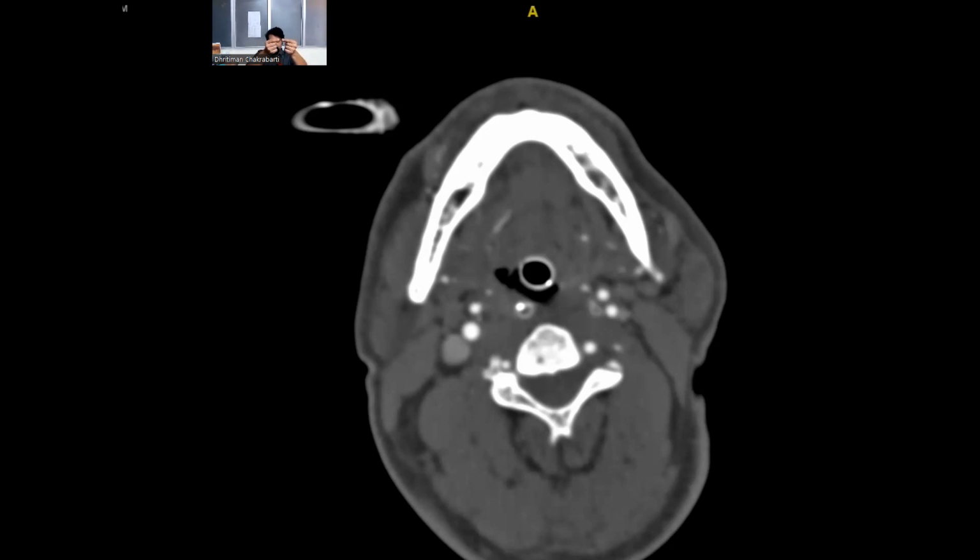They go ahead and join in the middle to form the anterior communicating artery. So this entire thing, the ACOM, the two ACAs, the PCOMs, and the two PCAs finally joining to form the basilar, is the complete Circle of Willis. Like I said, the complete Circle of Willis is not going to be present in all patients, but luckily I was able to find a patient in which the entire Circle of Willis is visible. So let's start with the posterior part of the circulation and then we will study the anterior part of the circulation in the CT scan.